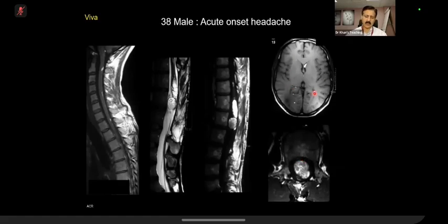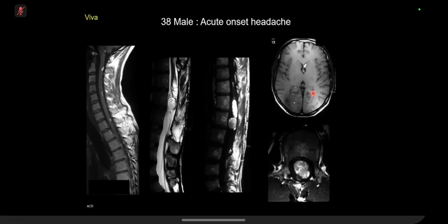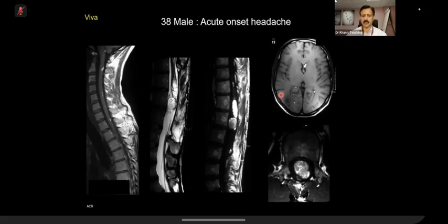What do you think is happening here? So I think that it's ruptured because there's evidence on T1 of hyperintense foci along the cord, as well as an intramedullary lesion that is consistent with a lipoma or a dermoid. So I'm concerned that it's ruptured, especially in the context of acute headache. That's fine. I've shown you similar cases before. Ruptured dermoid on an MR, they will show you a T1 weighted sequence with high signal in the CSF.